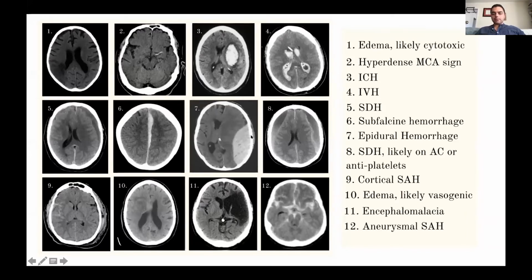This is a large epidural hematoma. It's bright, it's lens shaped, it's causing massive shift and mass effect. Bilateral subdurals, mixed density. You see how it's brighter here. So the more dense blood, probably the more acute blood, is tracking down here because the patient's lying down on their back. So you have to account for those things too. And then the more chronic blood is up here. So probably someone that was on anticoagulation, had a fall, and it's been intermittently worsening bleeding.